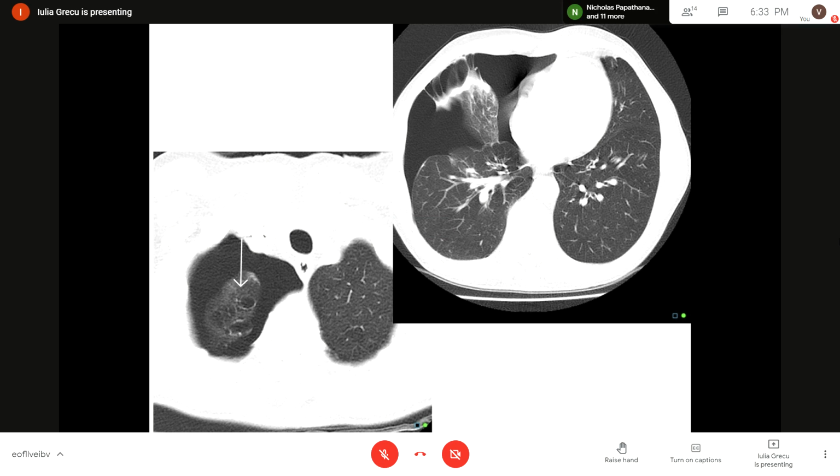Also, you see these bands here, some adherences, some fibrous bands that connect the visceral pleura to the parietal pleura, which suggest previous pleural pathology, some previous fibrotic changes in the lungs and pleura, which are considered aggravating conditions in the context of pneumothorax.